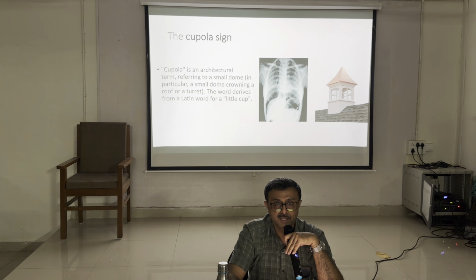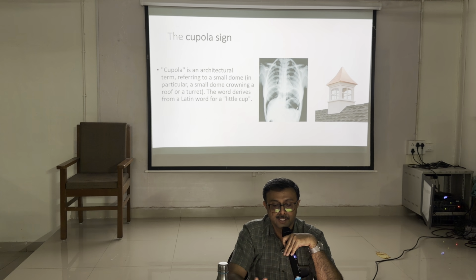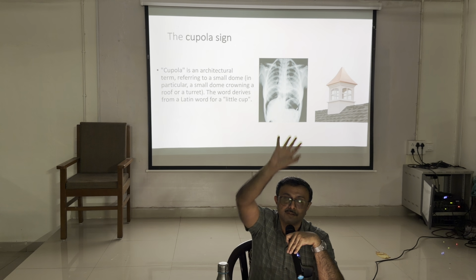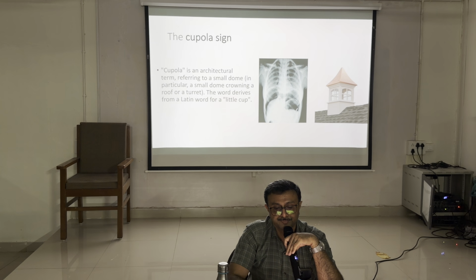So this kind of architectural dome is called a cupola. Here, the same kind of gas is visible at the highest level, so it is called cupola sign.